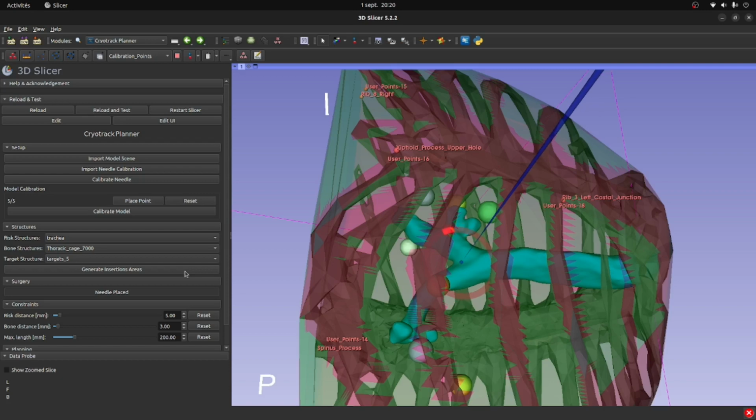The concept is that we have to keep this ring as small as possible during the whole insertion. And we will most definitely hit our target. Let's start. Keeping the ring as small as possible gets harder and harder the closer we get to our target. And this is a hit.